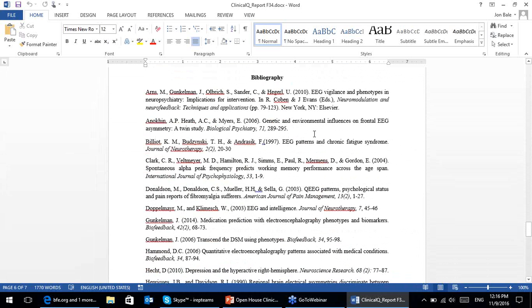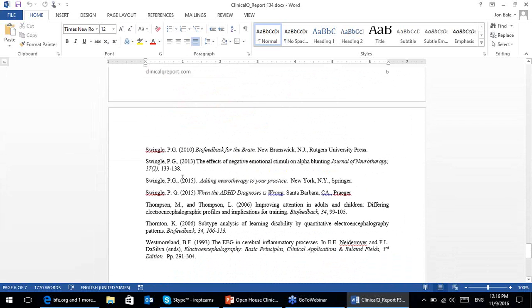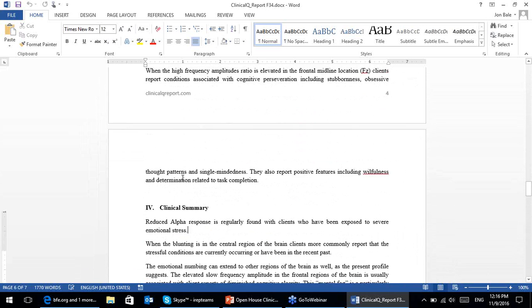So in case you're looking for references, some people are more scientifically inclined, or they really do like looking into where this data comes from. You have this list of references back here, and they can go explore that if they'd like to.